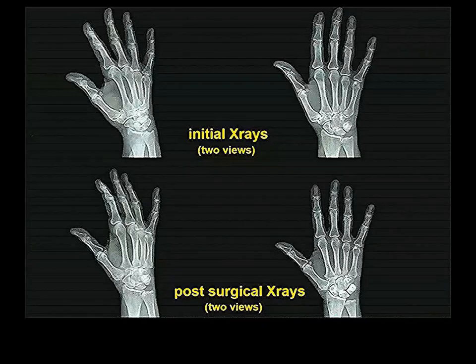One on the right shows it very clearly. Took it out? Sorry? You're right. They took it out. They took out the trapezium.